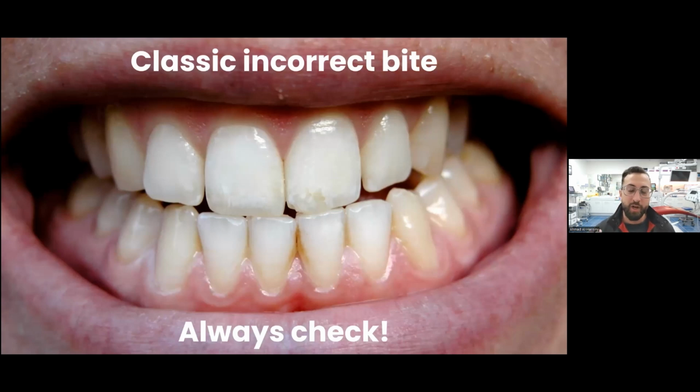And this happens to us when you're in a rush, when you're running late and you just want to do it really quickly. You don't really pay attention. And it's really critical to know that if it's not the correct bite, everything's going to go wrong. The AI in the software doesn't magically correct the bite for you. And I love technicians. They cover our butts in a lot of different ways. But even then, they will struggle to correct the bite like this. Although some AI tools are coming out because this is a common issue.